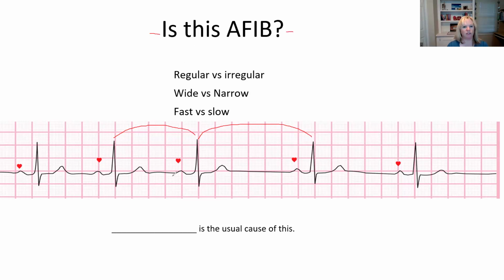And the question is answered because you have a P wave. This is not AFib. And yes, it is caused by breathing, and it is unfortunately a lot of times thought to be AFib. But this is sinus arrhythmia, okay? So sinus arrhythmia, let's talk about that real quick. Sinus arrhythmia happens in young people.